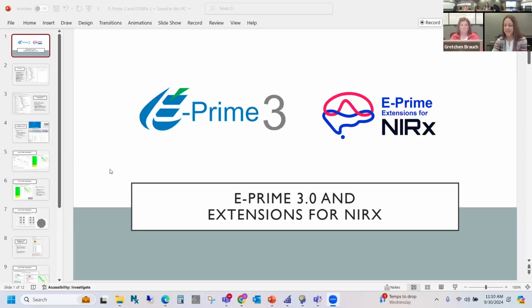Thank you, Franzi. I'm going to go ahead and share my screen. Okay, so as Franzi said, I'm going to go ahead and do an overview of the ePrime extensions for NIRx software.